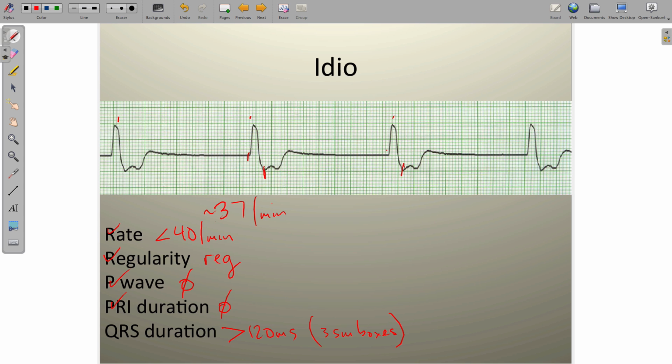So I'm going to put a line there, and I'm going to put a line there, and I'm going to say that actually that's where these are marching out. So if you look at this, these guys kind of line up here, and they line up right around here. We're looking at 1, 2, 3, 4, or about 160 milliseconds. Again, satisfies that requirement.